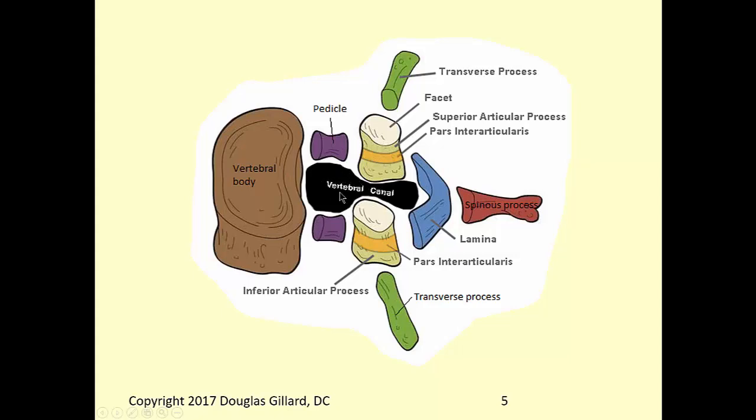And the lumbar spine, what does it protect? No, there's no spinal cord in the lumbar spine. There's a thecal sac, or aka dural sac, and the nerve roots are not embedded. Remember, in cervical and thoracic spinal cord, the nerve roots are embedded in the substance of the spinal cord. Not true in the lumbar spine. They actually hang like the root. Look, the early anatomists thought it looked like a horse's tail. That's called the cauda equina. Those are really the traversing nerve roots, as we'll learn. But it's protected by this posterior arch of bone.